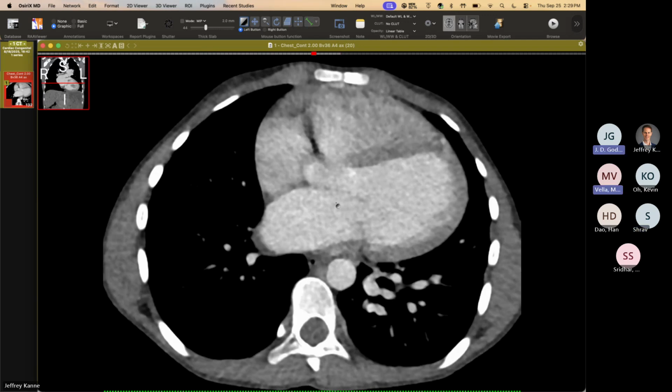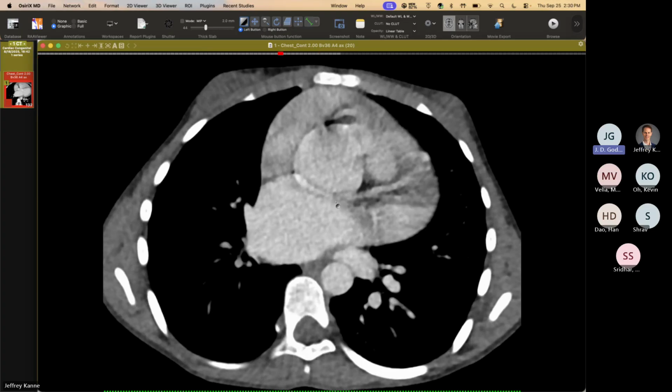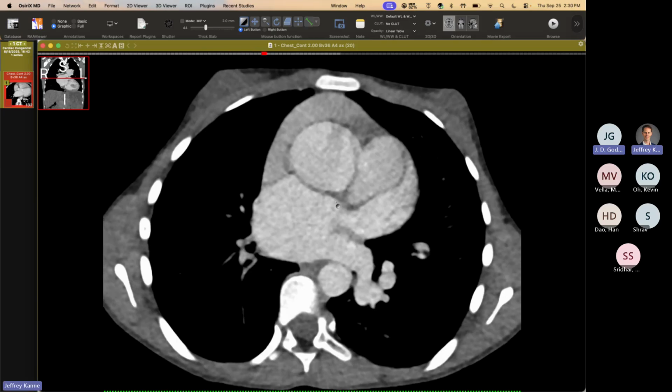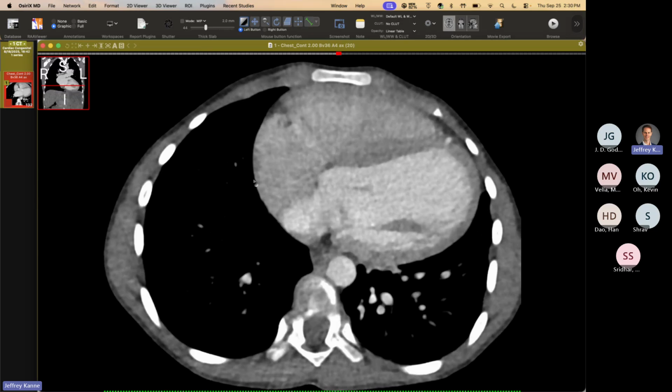Yep. So great. How old was this kid? 12. He's 12? Well, yeah. This is nothing diagnosed before, right? Nope. This is the initial discovery. Failure to thrive. You see the child's quite thin.